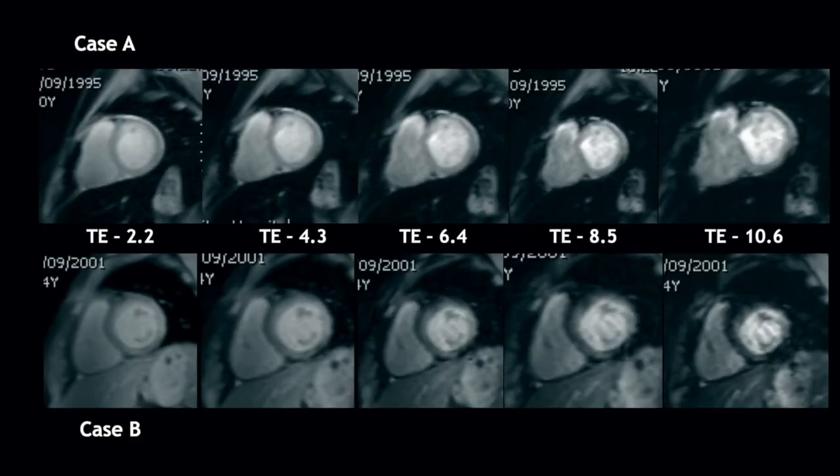Okay, this is the T2 star MRI sequence in the myocardium. Only 5 echoes are taken for the representation of the concept. In case A and case B, the first TE is around 2.2, and we have taken it till 10.6. You can see there is a decrease in signal intensity of the myocardium in case A as well as in case B when the TE time increases. But if you notice, the decrease in signal intensity is much more in case B compared to case A. That means there is more iron overload in case B compared to case A. So this is called the qualitative assessment.